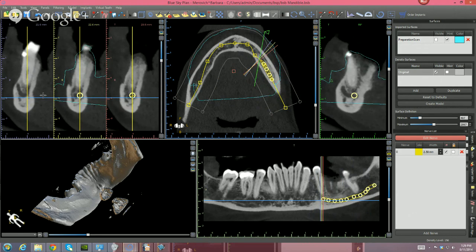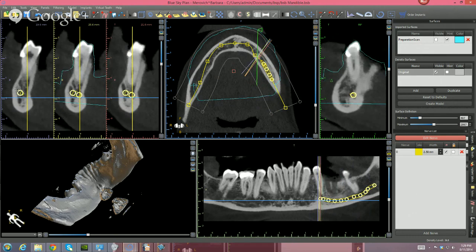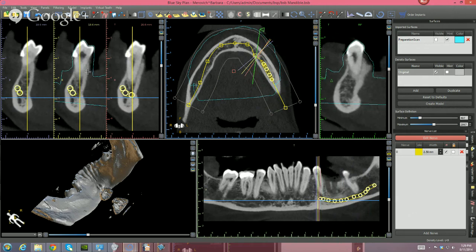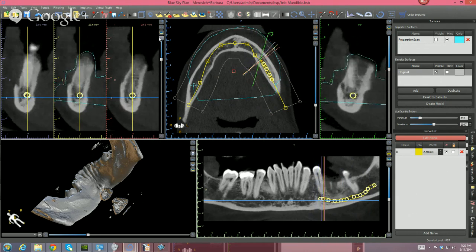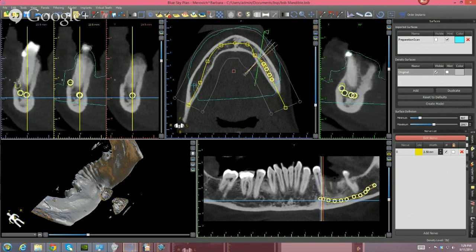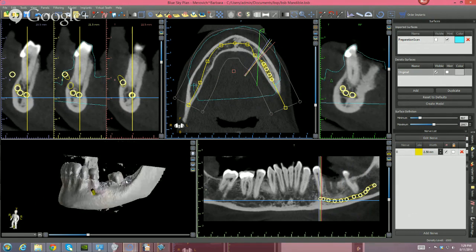So I can go ahead and make some dots over here. You see I can make my dots in different places. And let's see if I can find the exit. And maybe over here. Okay. Now that I'm done, let me turn this off and see. Sometimes it's good to see me have trouble with something also. And you know what? I got it.